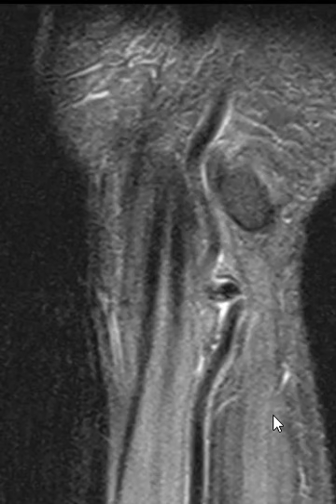This is a patient who had profound ulnar-sided weakness and can't even hold a glass. It hurts so much to flex the fingers. He had profound weakness in the fourth and fifth digits. He'd seen a couple of medical professionals.